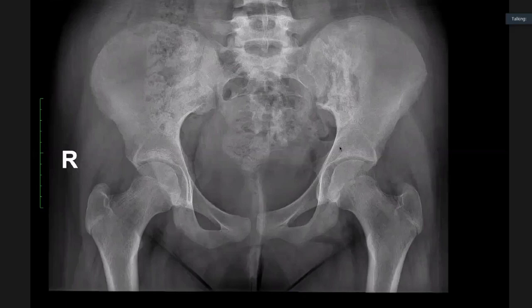Yes, sir. Okay. So the primary thing you were thinking: either this is infection, or the first thing you think is it's a neoplastic process like Ewing's, all right? Or the second is infection. Okay. Could it be inflammatory? Could it be sacroiliitis? She's 15. Yes, it can be.